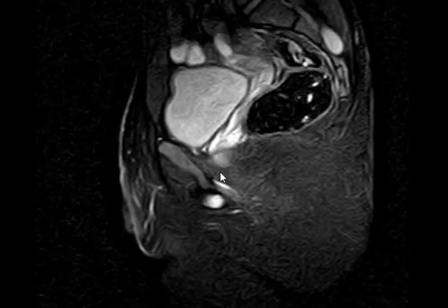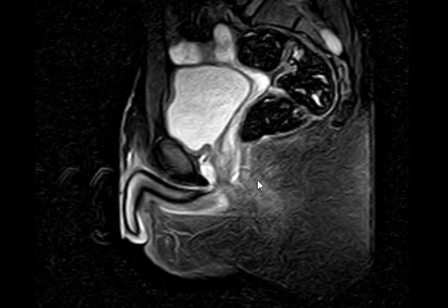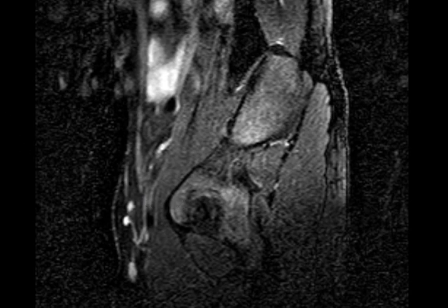And if you look carefully, the vagina here, because I think it's rudimentary, here. Yeah, rudimentary, okay? And I think there is some sort of an ovary. I saw that one. I think it's not vagina. It's a seminal vesicle. It could be. Axial uterus. Just a second, wait.